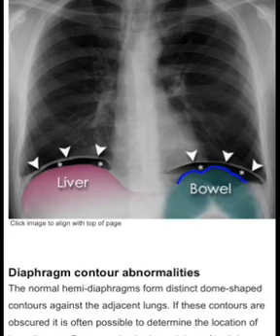Clinical information: acute severe abdominal pain, abdominal guarding on examination. Risk factors for peptic ulcers include smoking, high alcohol intake, and long-term use of non-steroidal anti-inflammatory drugs. Diagnosis: pneumoperitoneum. At laparotomy, a perforated duodenal ulcer was found.